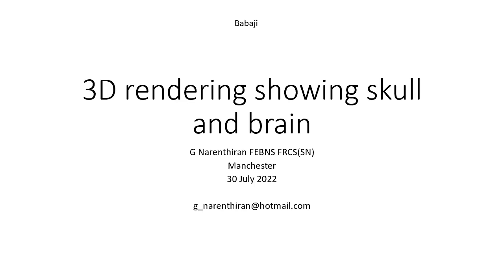This is a useful feature that allows rendering of both brain and skull, which helps in getting a visualization of pathology. I'm just going to take you through how I did this. You might already know, but if you don't know, you might want to try it.